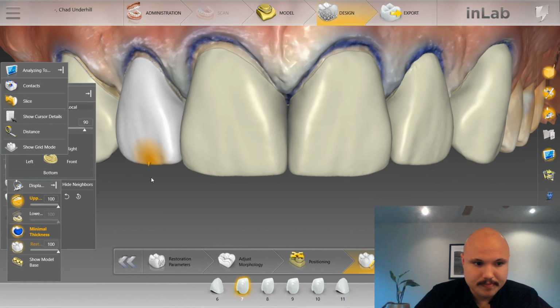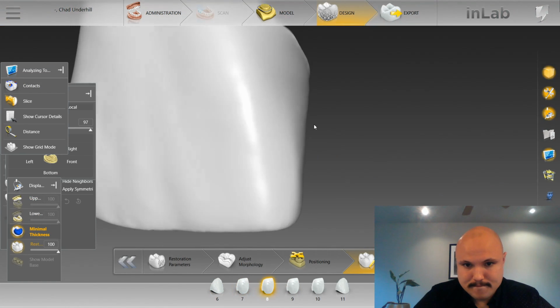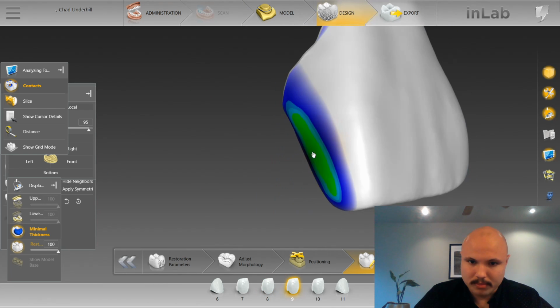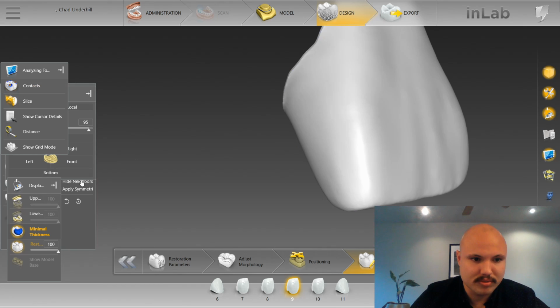Just the midline. Left. Contact. Now, usually when there's a lot more color on the midline, I would use the form tool and apply symmetric, but because there isn't that much color, I just lightly tapped the smooth tool on those spots of yellow, just going back and forth, and I'm sure that our midline's going to be fine.